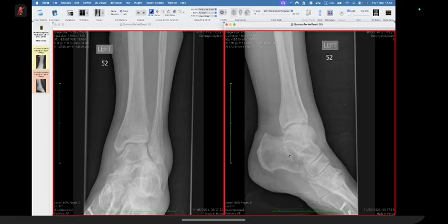There is a healing, I'm not sure, but there is something in the cortex of the navicular bone. Navicular is fine. The patient is a 63-year-old female. Anything else? You don't have much time. The thing is, I can't see a definite pathology.